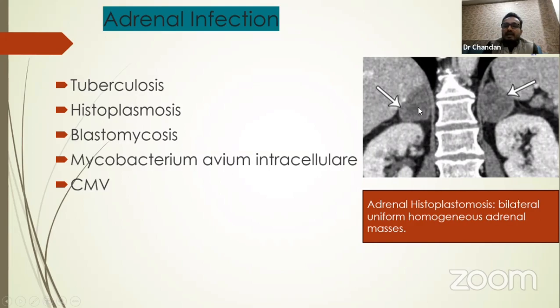both adrenal glands, and a few necrotic foci are also noted within both adrenal lesions.